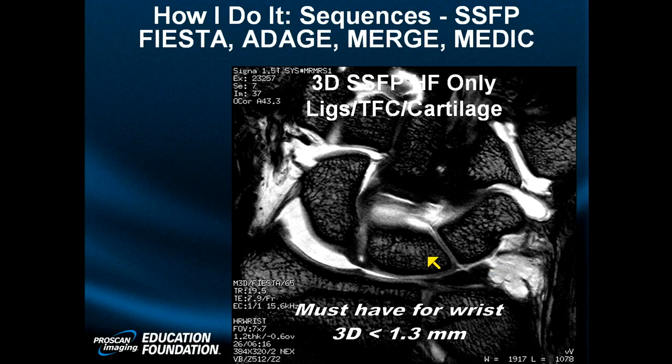Now, in small parts, I find even more value in the additive gradient echo image and steady-state free precession, the very heavily water-weighted arthrographic-like sequences. So steady-state free precession, also called Fiesta, a gradient echo, also known as adage, MFFE, merge, medic.